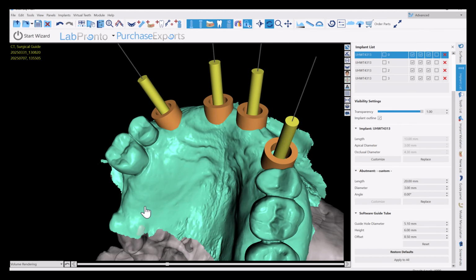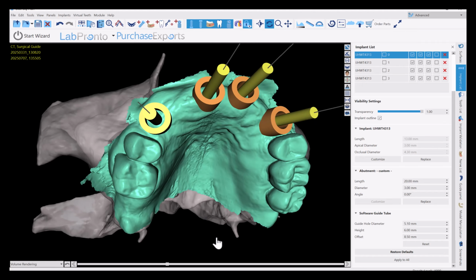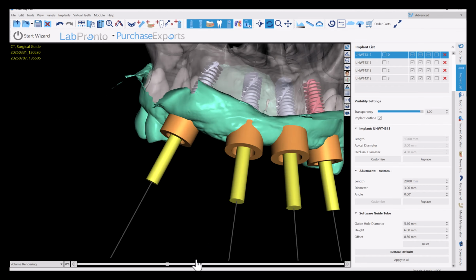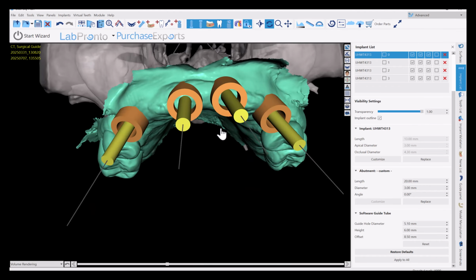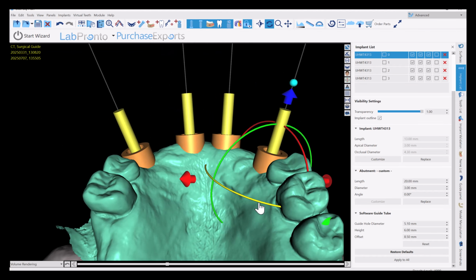And once I've done that, you can see I just don't have a lot of guide tube that's going to guide me up above the gingiva. Now yes, a flap is going to be done, but your other option here is you could raise the guide tube up. So these are currently 13 millimeter implants, meaning if you use the standard offset, then when you're drilling, you're going up to the 13 millimeter drills. You've only got one drill beyond that, which is the 16 millimeter drill.